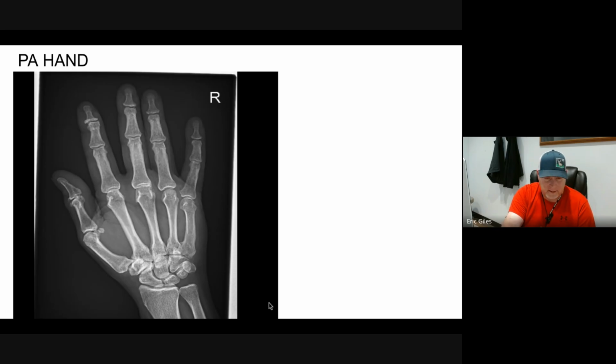Okay. Now aesthetics, does it look good? Does it look pleasing? Yeah, it does. It's a nice looking PA hand for sure. It's hung correctly. The fingers are pointing up like we always want a hand. If we were to take that image and it came out sideways or fingers pointing down, we could just really easily hit the button that rotates that image up and makes it look correct. For us looking at that, it is a right hand. If I were to stick my hand out in front of me, it would match that image.